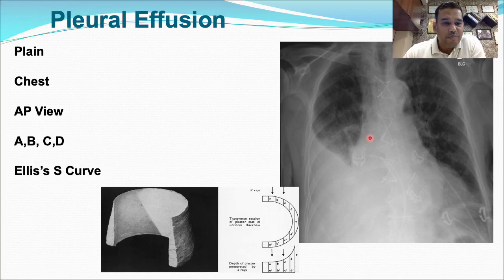So the explanation is basically this. Try to understand this picture. This denotes your pleural space. Whenever there is a fluid, it will mostly gravitate towards the lower part. So more fluid will be in the base, and the thickness of the fluid collected will be more at the base. As the fluid increases, this peak will slowly rise. So the thickness will be highest at the base, whereas slowly, as the amount of fluid increases, the peak will rise, but it will be thinner as compared to the base. So it will give you such a picture of the fluid present in the pleural cavity.